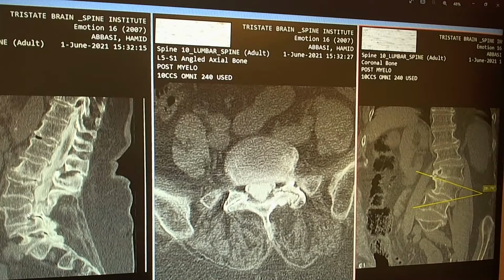Any takers about how air gets there? Obviously, we talked in one of our meetings that air inside of the colon and in the intestine is from decomposing material. Fracture? No, even if it's a fracture, if it's not an open fracture, how would the air get into a not open fracture?